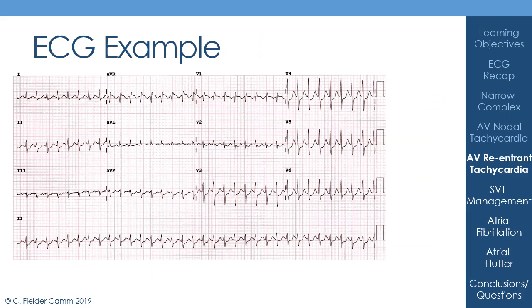So here's another ECG example. I'll give you a few seconds to go through it, pause the lecture, and then I'll go through it afterwards.